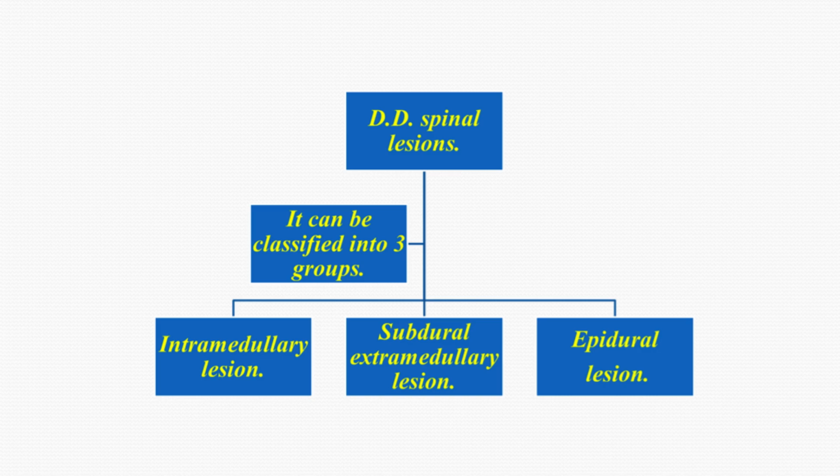Differential diagnosis of spinal lesions. It can be classified into three groups: intramedullary lesions, subdural extramedullary lesions, and epidural lesions.